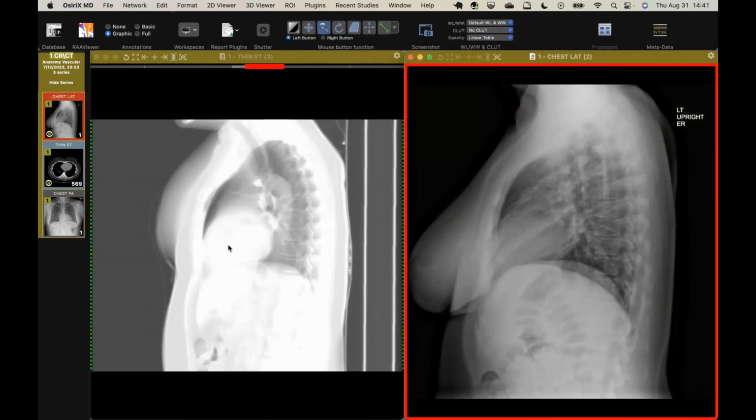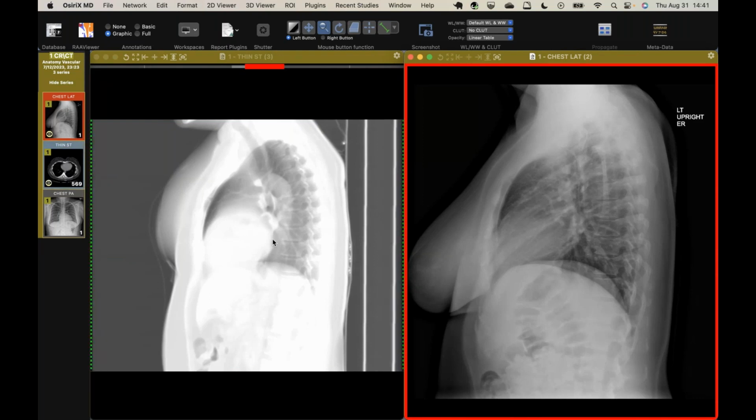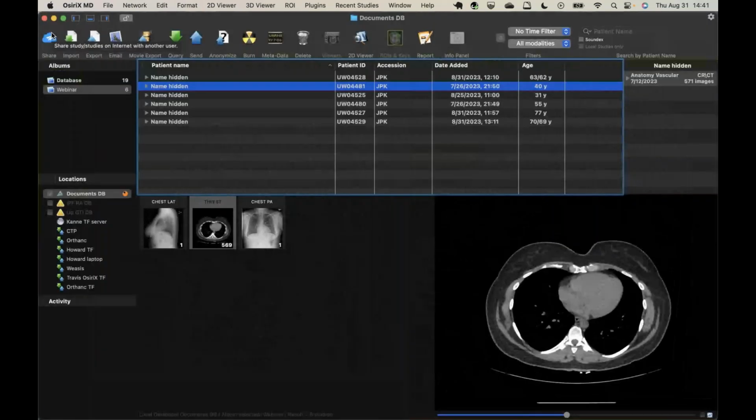Every time I see this, I always go back to the radiograph to see if I can find it. I think the only time I've called it prospectively was when there was a catheter in it. That was it. All right. So those are the congenital ones.